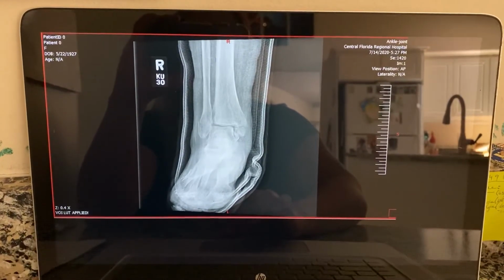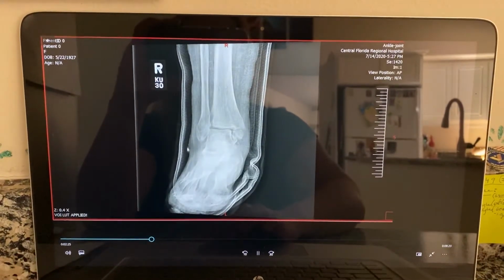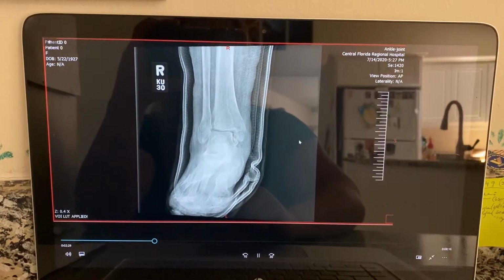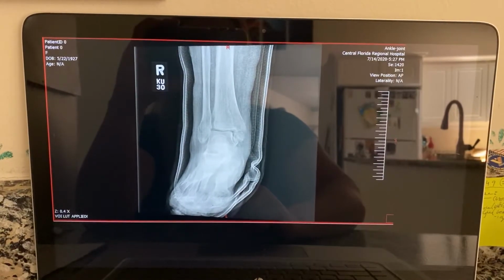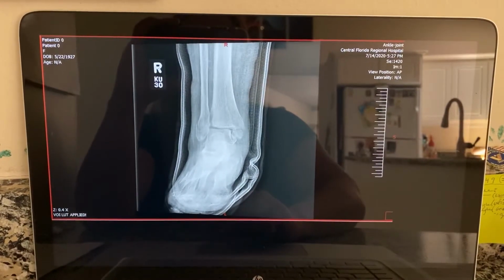That's an indication of past inflammation around a certain joint where bone is weaker than normal, but not so far gone that they break easily, which is the hallmark of osteoporosis. The images were of diagnostic quality.